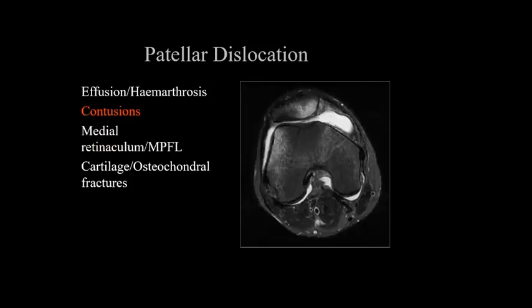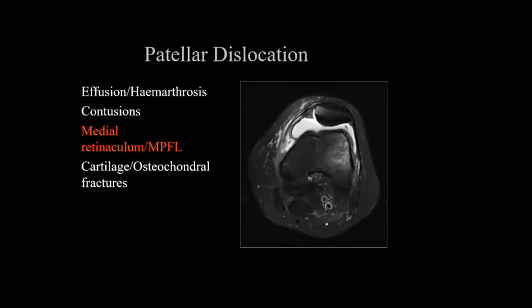It actually comes up, this one, in the OSCE. I had this one in one of the OSCE exams, in the board exam, with just one image on the OSCE station, and the diagnosis is a prior lateral patellar dislocation, or you can say recent lateral patellar dislocation. Again, another patient with lateral patellar dislocation, but there is disruption of the medial patellofemoral ligament here.